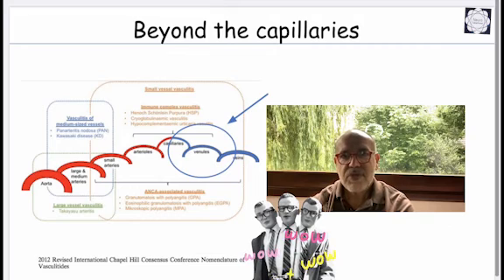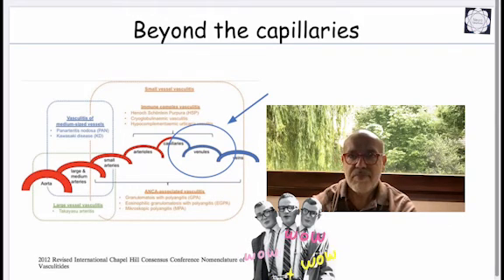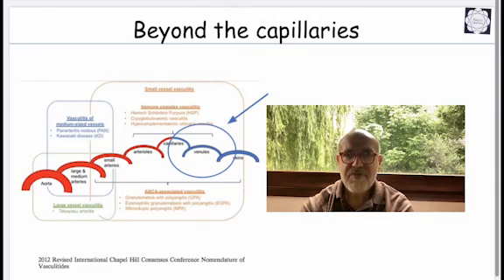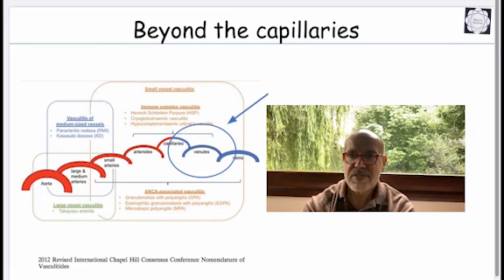But today we talked about the perivascular pattern of enhancement, which is a perivenular pattern in reality, and this is not a real vasculitis because the target is not the vessel. This is just a first stage of an inflammation process where the target is beyond the vessels.